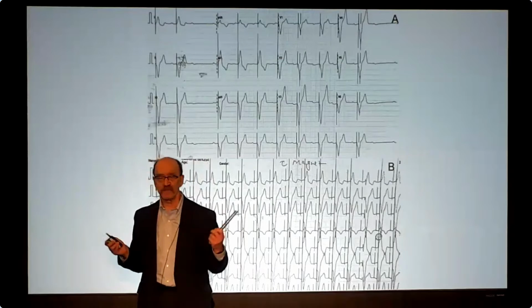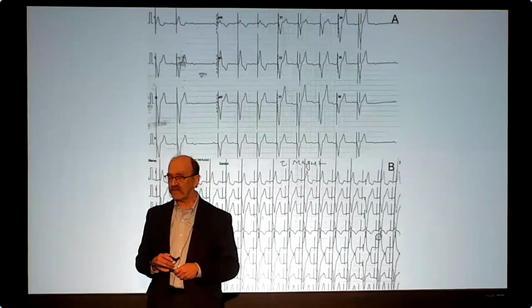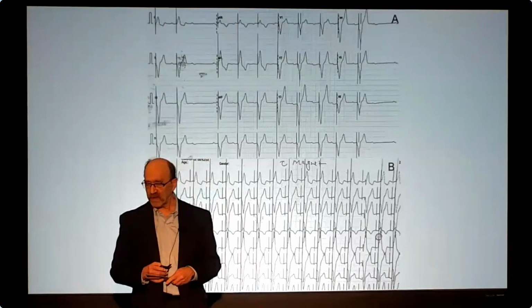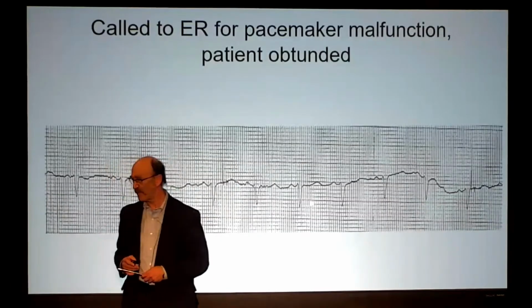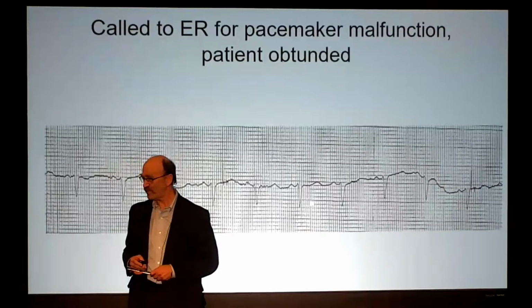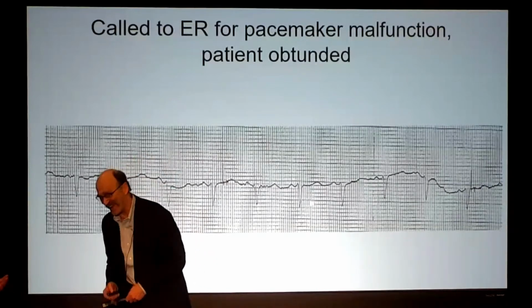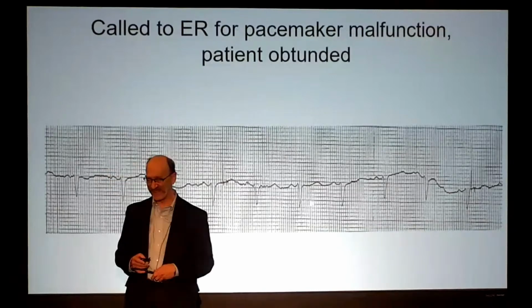So just a thing on spikes. You've seen something like this before. I'm showing you an EKG, some rhythm strips, and then... Reps get really mad when you get called to the ER at 2 in the morning because the pacemaker isn't working and the patient's in AFib going at like 100 a minute. I know this because my son was a rep. He doesn't do that now.